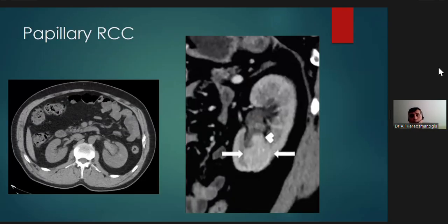So let's move on to the urinary system. The kidneys are the leading organs in the urinary system, and hemorrhagic lesions and hematuria are very common in the kidneys and the bladder, to say the least. So this patient has no known history of any malignancy, presented to the urology clinic, not to the ED, with gross hematuria, with clots.